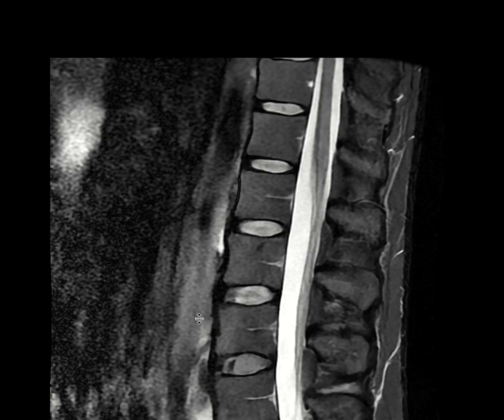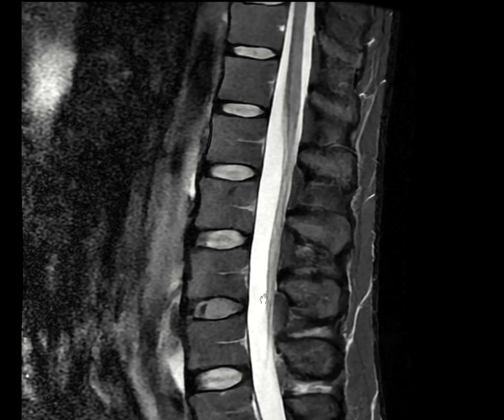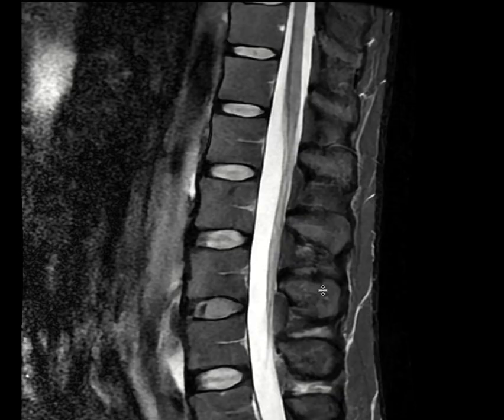This is a STIR sequence, which is a very important sequence for the lumbar spine, because anything that is pathology, metastasis, or edema is going to be bright on this sequence. So basically we are going to suppress the fat. You see that the subcutaneous fat is all dark, and then we see some normal vessels here, the spinal canal is bright, and then this is the cord. We see the distal cord and the conus, and then we have a suppression of the T1 brightness that we saw on the fat, and everything is dark.